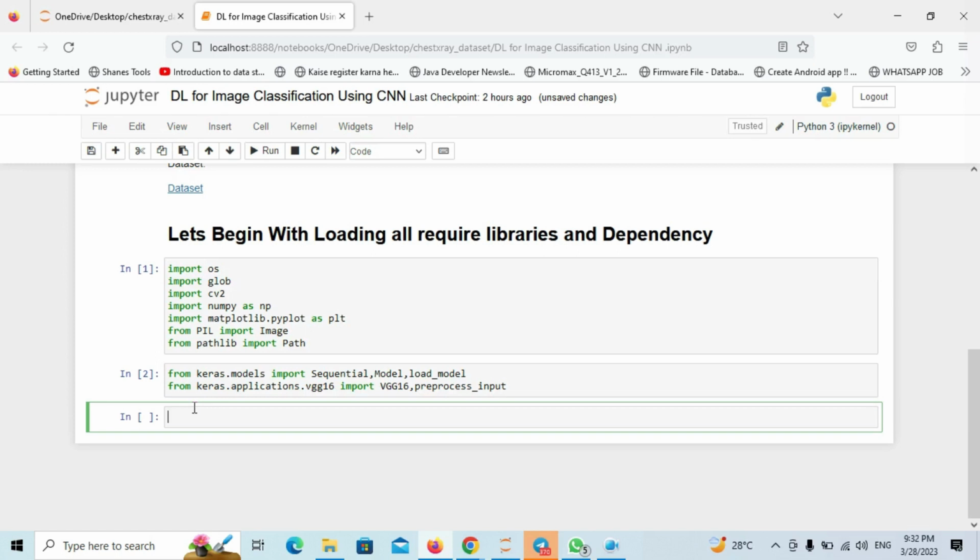There are certain libraries I am going to make very clear, so you will understand things while you are working around it. These are the libraries which will not work. For example, if you write preprocessing.image and import ImageDataGenerator like this, it will work. But if you write it the other way, it will not work at all.